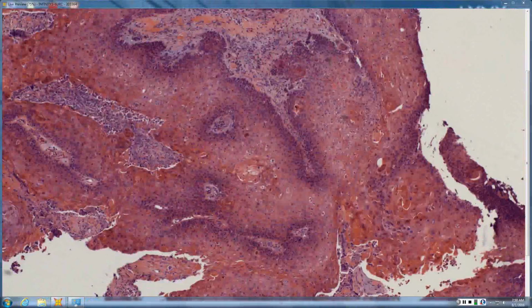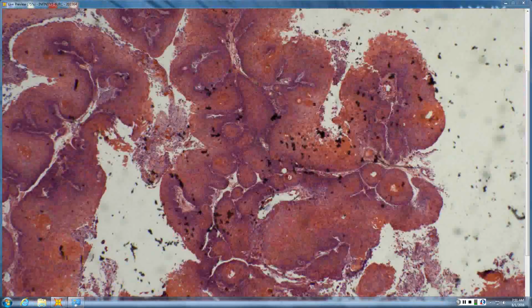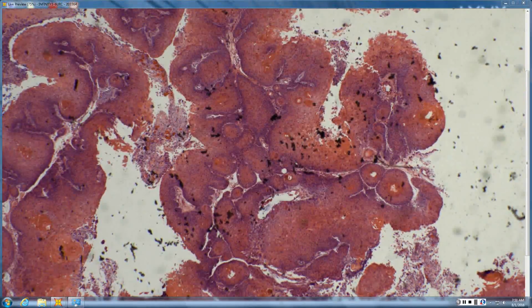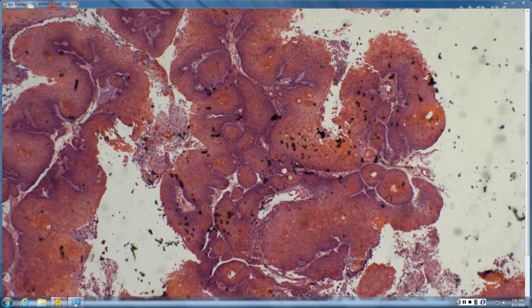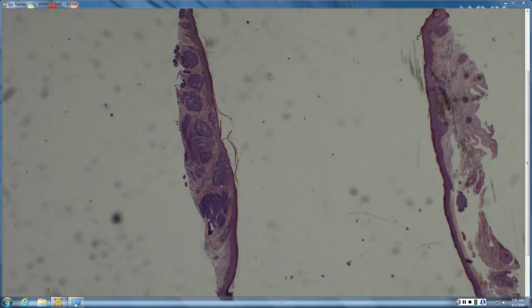The key would be getting a sense that you're looking at a cyst with an infolding wall, kind of a rolls and scrolls pattern. But when only a piece of it has been taken out, it can be tricky, and it's a benign tumor that often gets overcalled. Okay, so that was a little tricky with its tricholemmal keratinization.